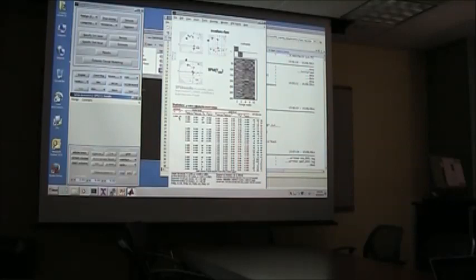You can ignore the set level, because no one really uses that. You get both family-wise error and false discovery rate values at the cluster level and the peak level, and corresponding uncorrected p-values, which give you all the information you need to say whether some region was significantly activated or not.